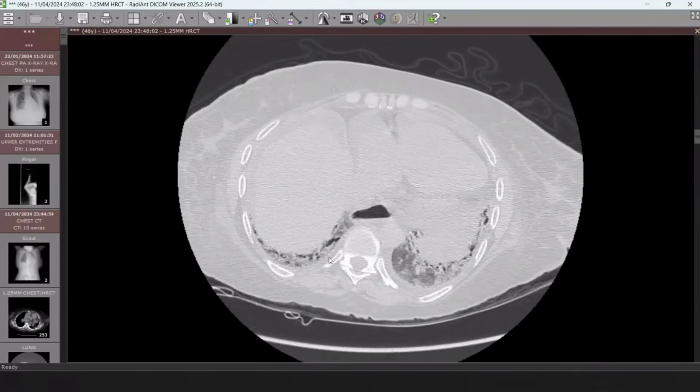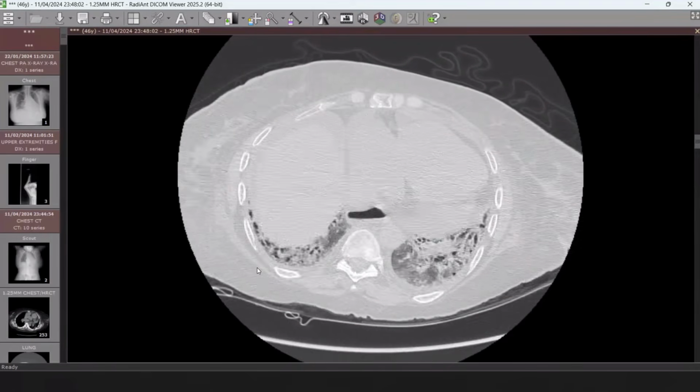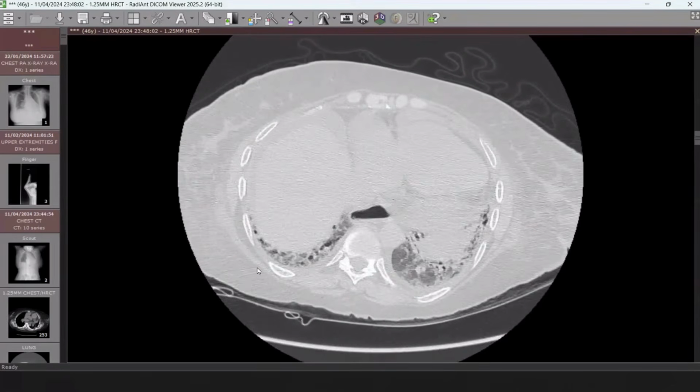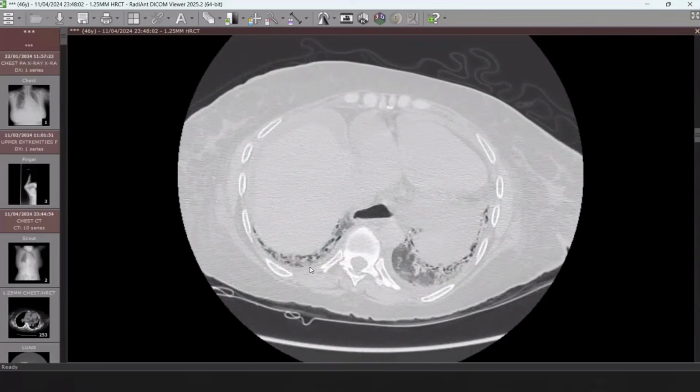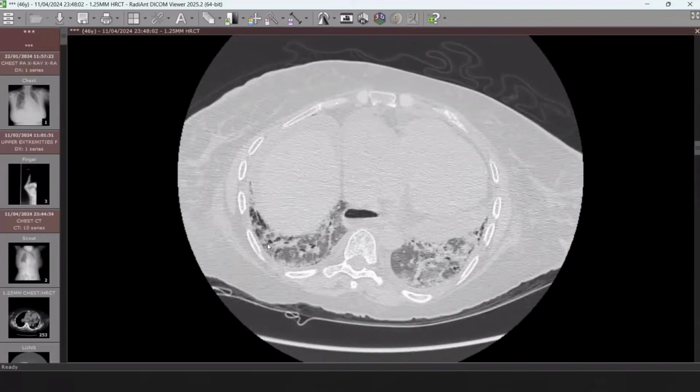Okay. Do you have any cystic honeycombing? There is more ground glass than cystic honeycombing, as I can see. Maybe there are a few cystic honeycombing changes at the most peripheral basal lung zones starting to appear. Yeah, you are right. Okay.